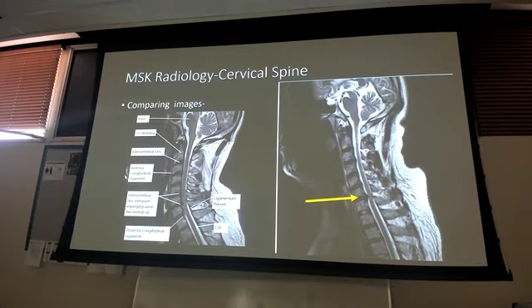Alright. So here's what it looks like. Big yellow arrow sign. On the test you won't have a yellow arrow sign. But what stands out to me when I go through this, right? I follow my spine all the way down. Let's pretend like the tools I've taught you for x-ray and everything too. I'm also following my CSF down. Does it look the same all the way down? It should, but it doesn't.